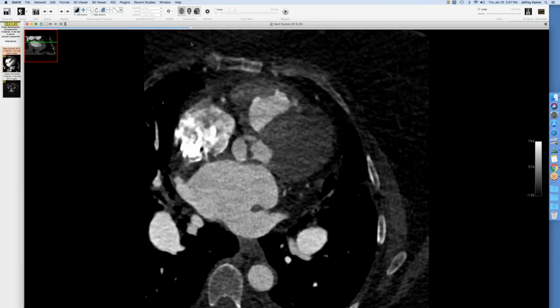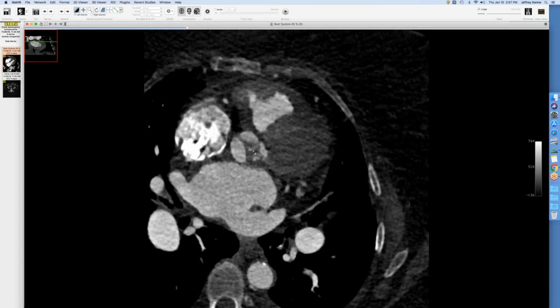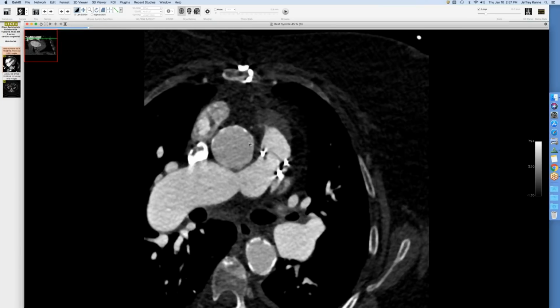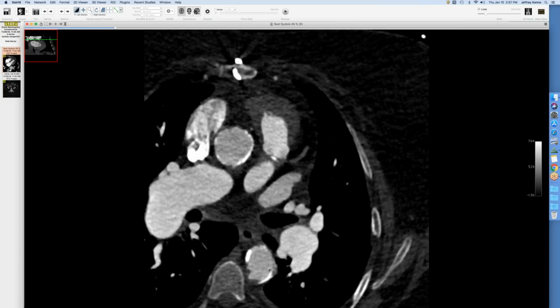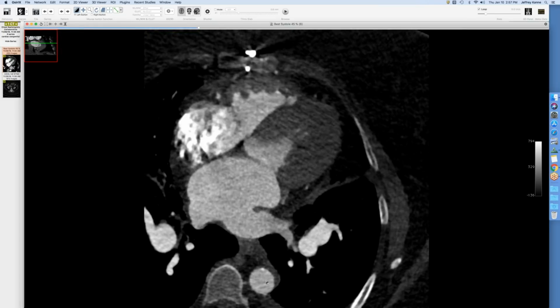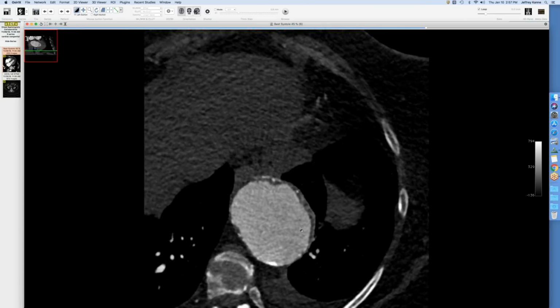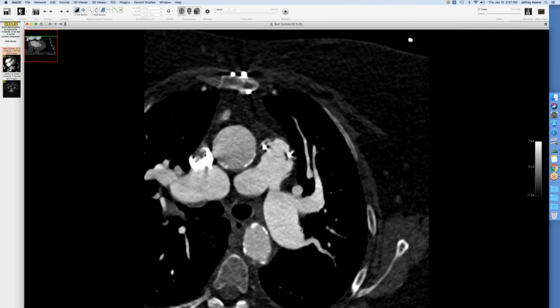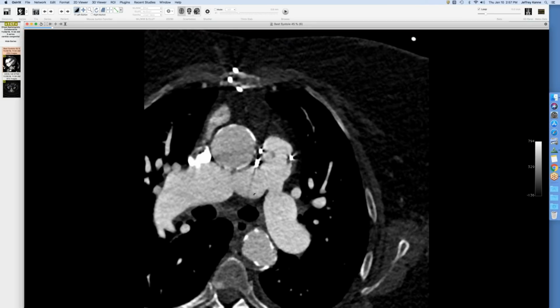But she's got a lot of aortic disease as well. You can see she's got a really thickened aortic valve. She's got atherosclerosis and her aorta's dilated. This is a cardiac portion, so I don't have the whole thing. But then you can see as we go down inferiorly, she's got this huge aneurysm. So this was to evaluate all of that as well. So, and presumably all related to congenital rubella, but it's just a nice example of branch pulmonary stenosis.